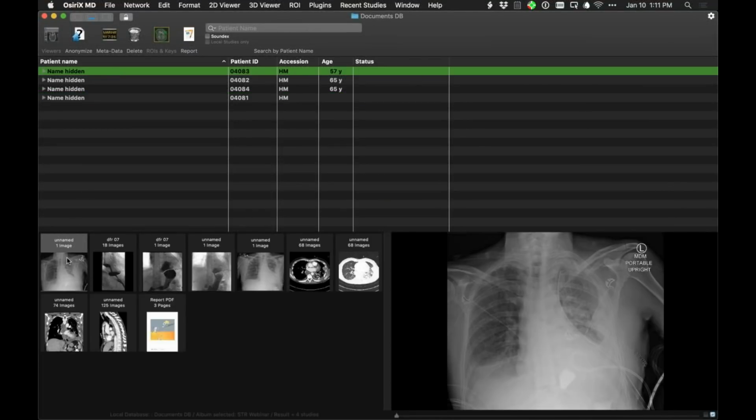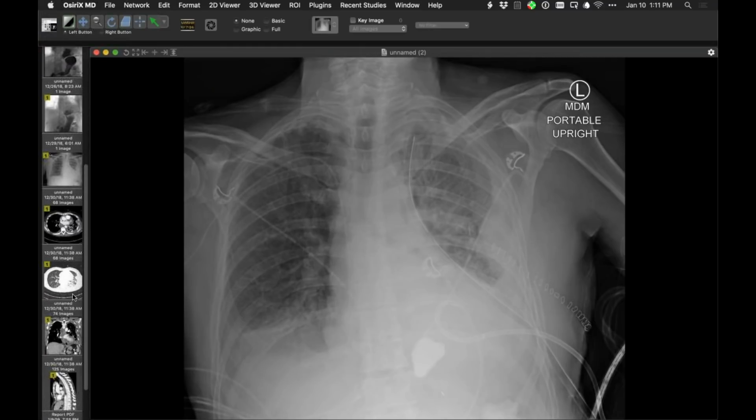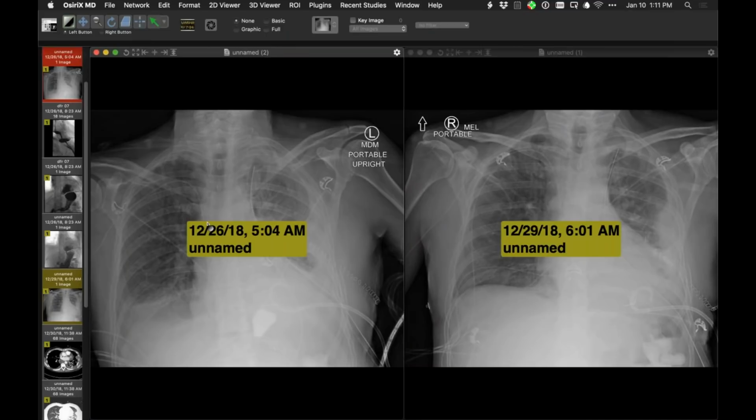Onward. Okay. This one is just a curiosity. The likelihood of coming across this in chest imaging is pretty small, so I will show it to you because it's really quite interesting. We have two radiographs here, and the time interval between the two doesn't really matter, because there's a new finding on this one.